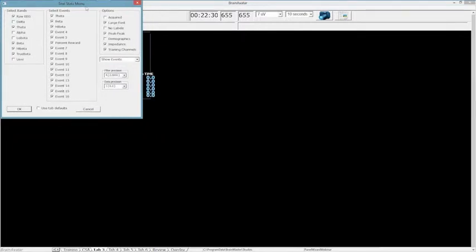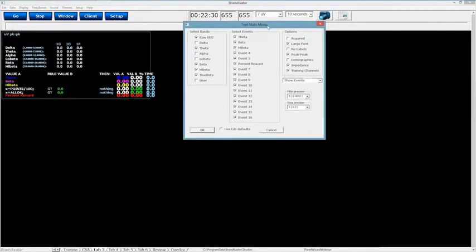In the display, we've given a lot of customization that can really occur. For example, you can choose what band you're looking at, and you can also choose what event you're looking at. Now, one of the important things I'm going to do is show you one of the features that's in there, and I've had a lot of people ask me about this. Why is it done like that? Why are sometimes they checked off and sometimes they aren't?